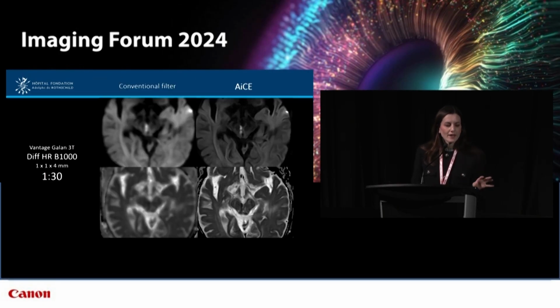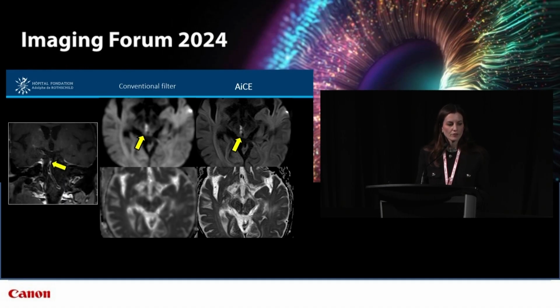Moving away from MS temporarily, just to show you this beautiful case from a few weeks ago of a patient who presented to our emergency department with abrupt onset diplopia. And the high resolution diffusion weighted sequence shows an acute ischemic infarct in the region of the right third nucleus. And the detail we achieve after ACE, I think, is incomparable. The signal to noise is markedly increased. And the infarct was due to a tight stenosis of the basilar trunk from an atheromatous plaque, which you can see is this area of non-circumferential enhancement on this 3D black blood vessel wall sequence.